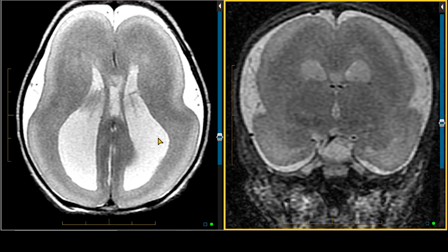At this point, instead of just Lissencephaly, which means smooth brain, it can also be referred to as Agyria, because there's essentially no gyri. The coronal image here also shows the temporal lobe is just one single curve on the periphery with no surface undulations. You see that subtle curvature, the concavity for the Sylvian fissure, and we're not seeing any sulcation whatsoever in the frontal lobes. This is a fairly severe appearance.